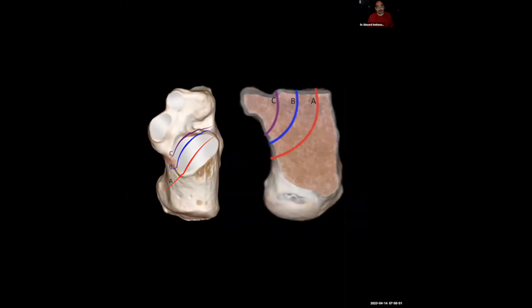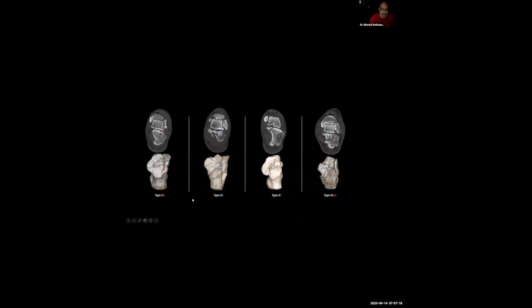So as I mentioned earlier, that A and C that you saw, we can see here. Now we can understand where that primary fracture line develops, A, B, and C, and that helps us to understand the Sanders classification. To tie everything together, the Sanders classification is basically a CT classification, but if you count the number of fractures through the posterior subtalar joint, you can have 2-part, 3-part, or multiple comminuted fractures. But if it's non-comminuted, for purposes of the literature if you review it, non-displaced, misspoke.